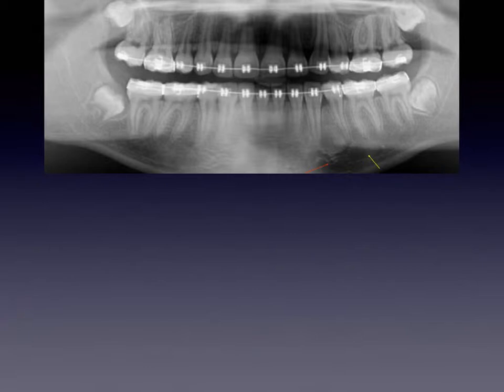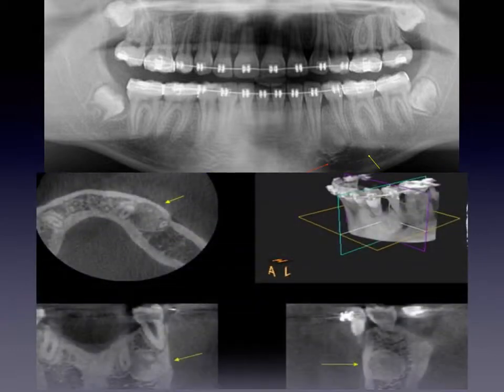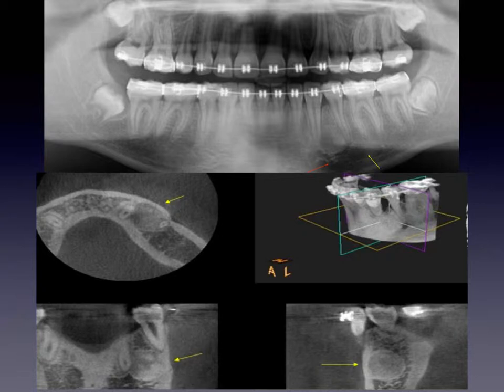But really, where is it? If the oral surgeon is going to go in and do some treatment, they need more information than this. Which side of the mandible should they approach this lesion? Is it through the cortical plate? When you take a 3D to view this, you can actually see exactly where these lesions are.